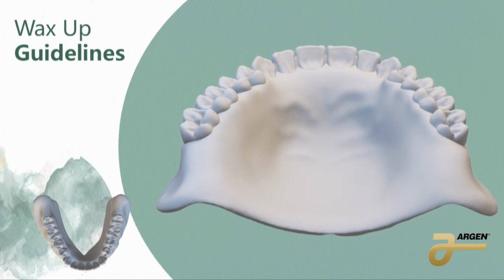If we look back here, in the back here, we have a muscle here. If you touch your back tooth and you open and close your mouth, there's a big muscle here. And so if we fill that area up, leave it round and bubbly, that muscle is going to be pushing on it. It might push our denture out, or it might just push it in. What do we have now? We have movement. We have sore spots. Your practitioner is not going to adjust that spot. They're going to adjust the underside. It's not really going to fix the root of the problem, right? So we want to make sure that we're carving that out to allow space for that muscle to move and function.